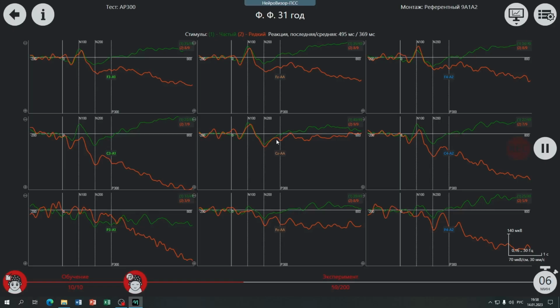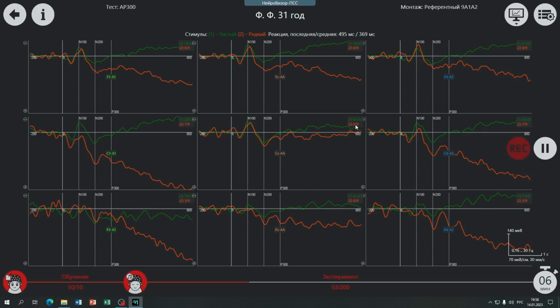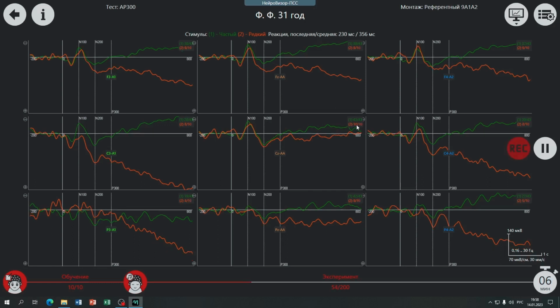This positive potential deviation will become more pronounced as the number of averaged epochs rises. Currently, their number is rather small, and we can use only 9 analysis epochs with 9 averages. It is yet insufficient to effectively detect the evoked response.